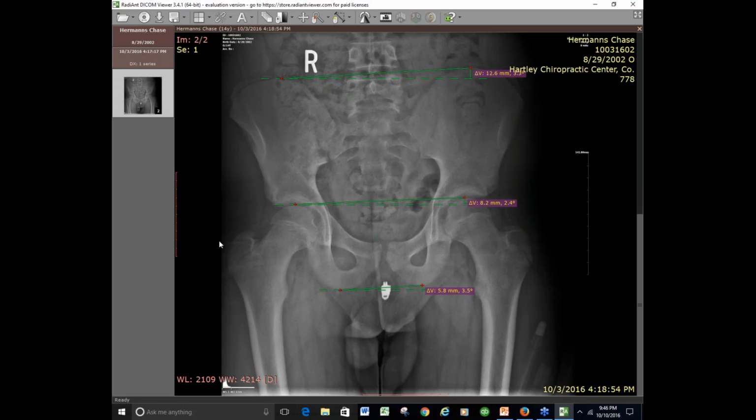This is one that made it quite obvious that this beam, I was like, something's going on. Either he bent his knee or, you know, something happened. And he's like, no, I didn't. They set me up just right. So we ended up going down there, and this was all a result of the X-ray projector being too close to the X-ray film, which is not something we had run into very often.